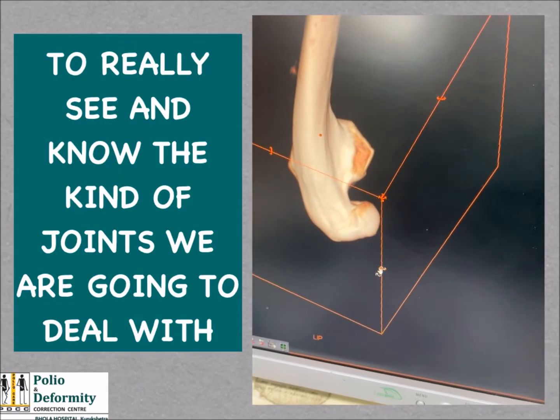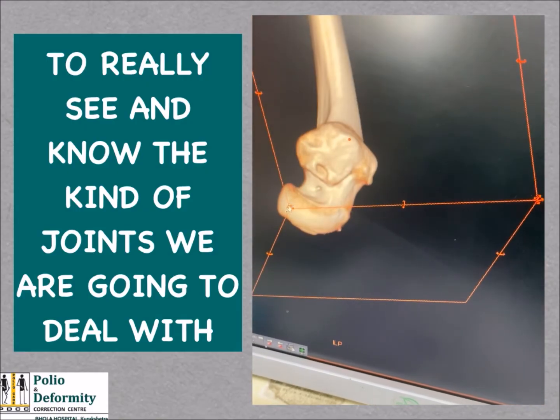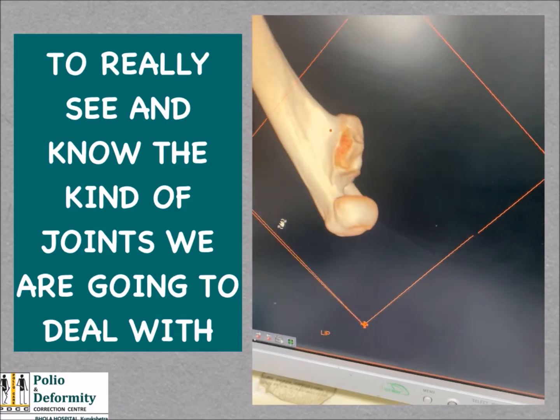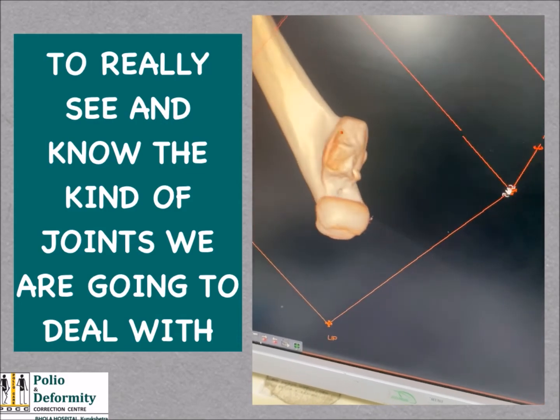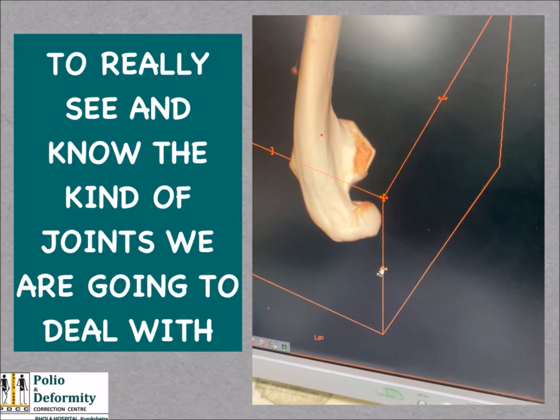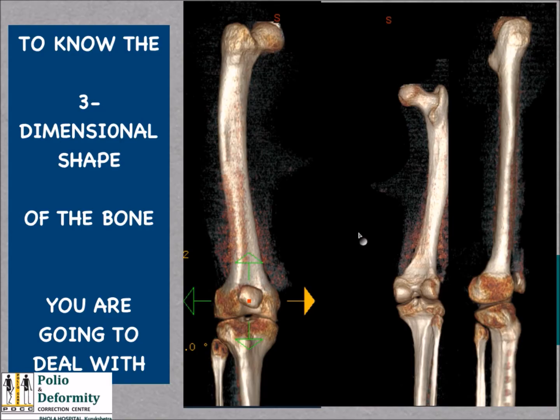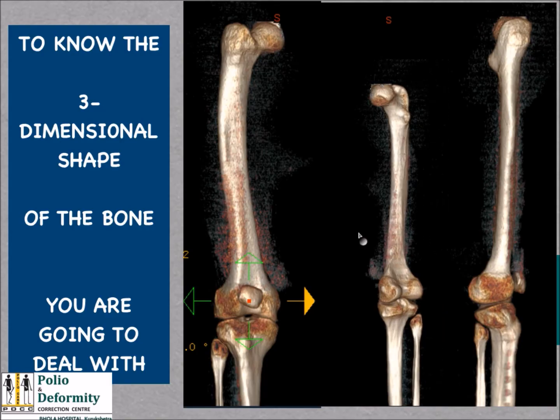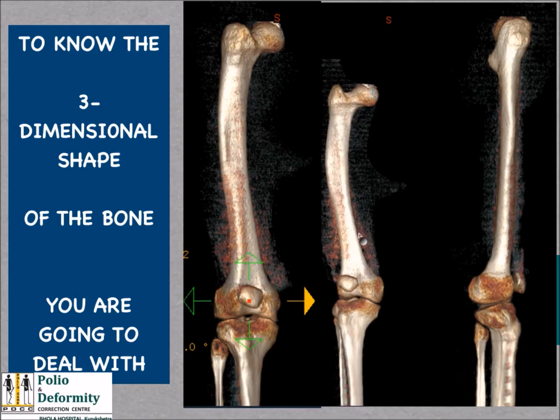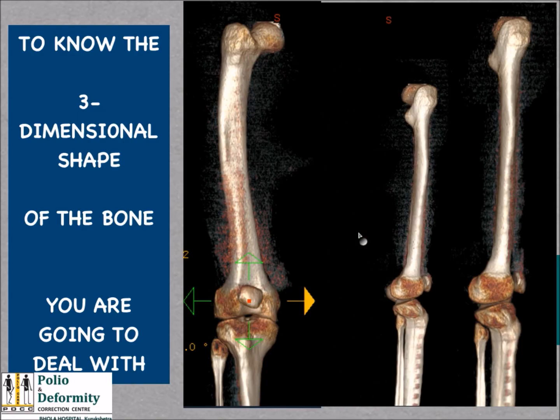And dear friends, you can really know the kind of joints you are going to deal with, which is very difficult in plain scanogram. You can also see the three-dimensional shape of the bone you are going to deal with, like this. Femur is almost a flat femur.